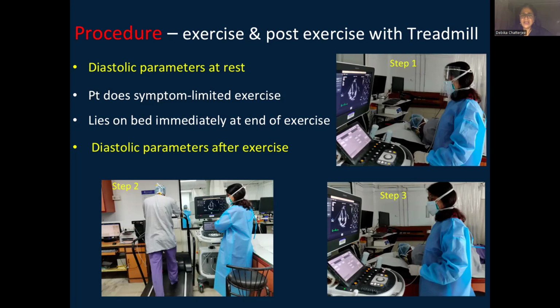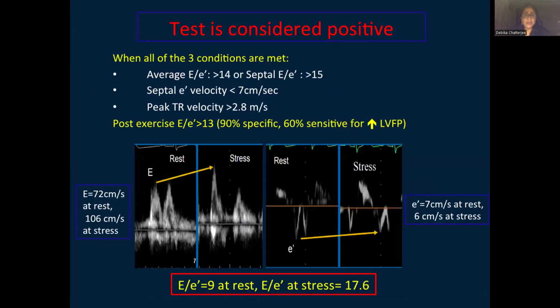One difficulty is that because of the tachycardia as the patient exercises, there is a merge of E and A waves, so the E-A ratio becomes a problem. But if you wait for some time, a few seconds, half a minute, the E wave gets separated, but the diastolic dysfunction persists for some time, so there is no problem. You can get the values.